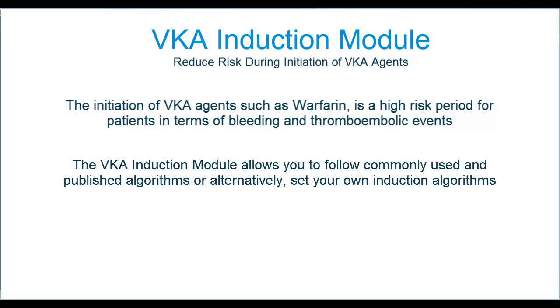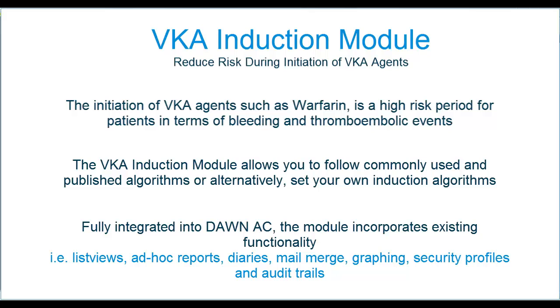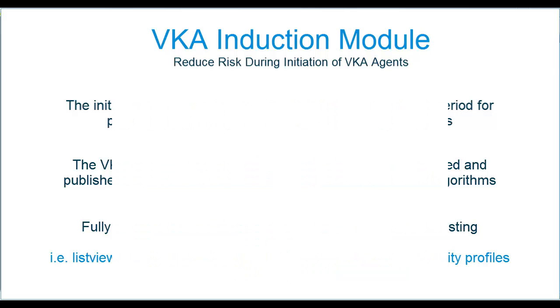Inducing a patient onto warfarin is a high risk activity, so the Dawn software provides induction dosing guidelines based on published scientific papers. We don't recommend using the maintenance module within Dawn AC for dosing induction patients. The reason being is that the maintenance algorithm assumes that the patient is on a stable maintenance dose. So we don't want Dawn using that algorithm to suggest a dose for the patient while they're being induced.